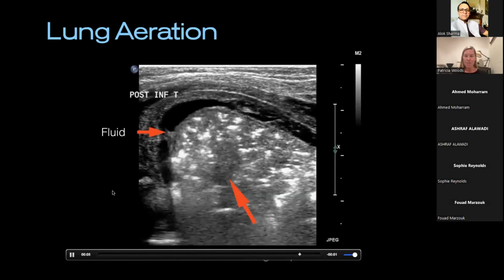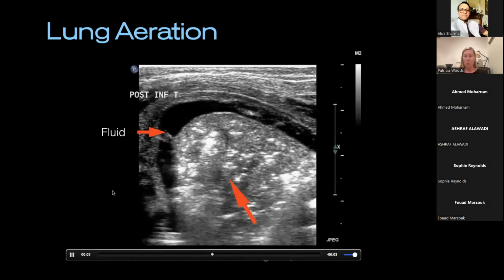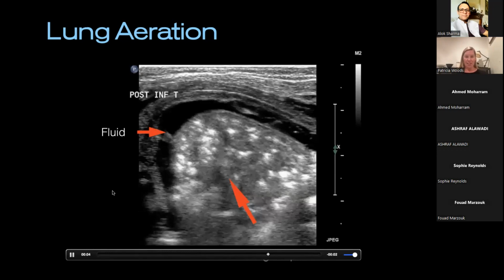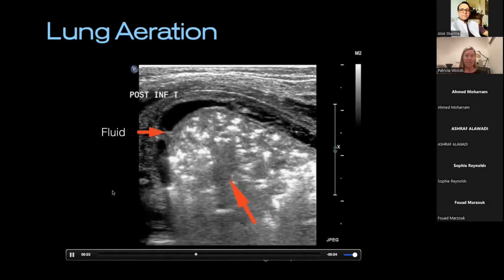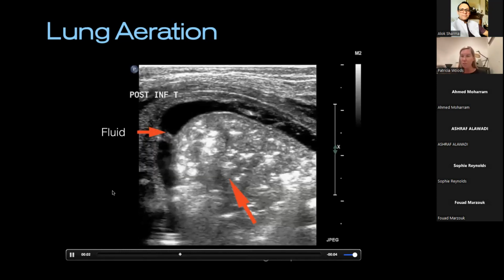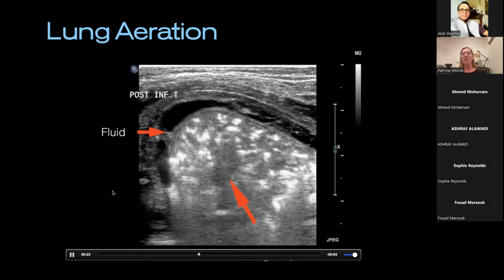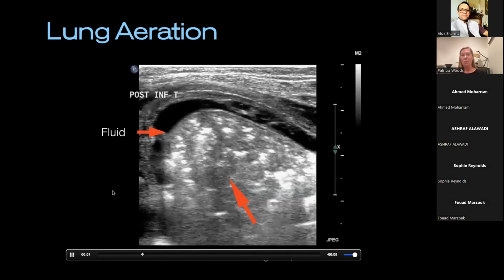Dynamic bronchogram, well aerated? Yeah, so I would say it's not well aerated at all. You're observing a picture of hepatization because you've got these sparkly little bits that are bobbing in and out. You've got these areas reflective of fluid and air trapped. And I could not tell you if that's blood. I couldn't tell you if that's Pseudomonas pneumonia. You have just got a massive region of lobar non-aeration or suboptimal aeration.